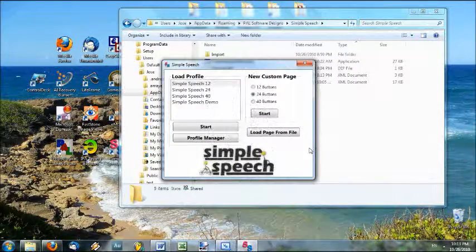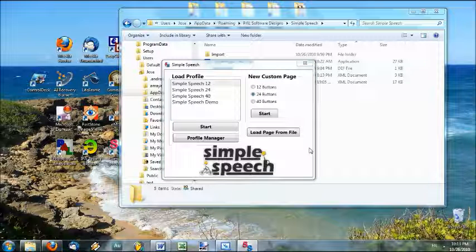Welcome to the video tutorial of Simple Speech, the easy communication alternative. In this tutorial, I'm going to walk through some of the basic features of Simple Speech so you can really see how easy it is to use.